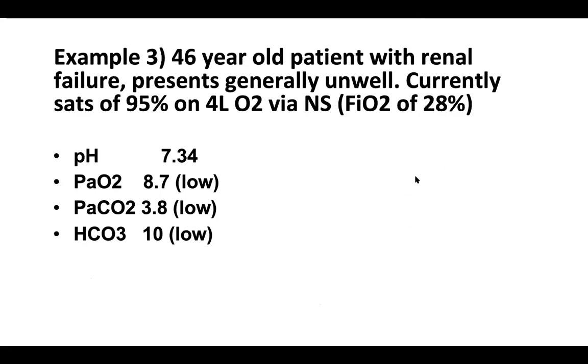So does anyone want to have a guess? So we're saying that the pH is low. So Stephen's saying metabolic acidosis with partial respiratory compensation.